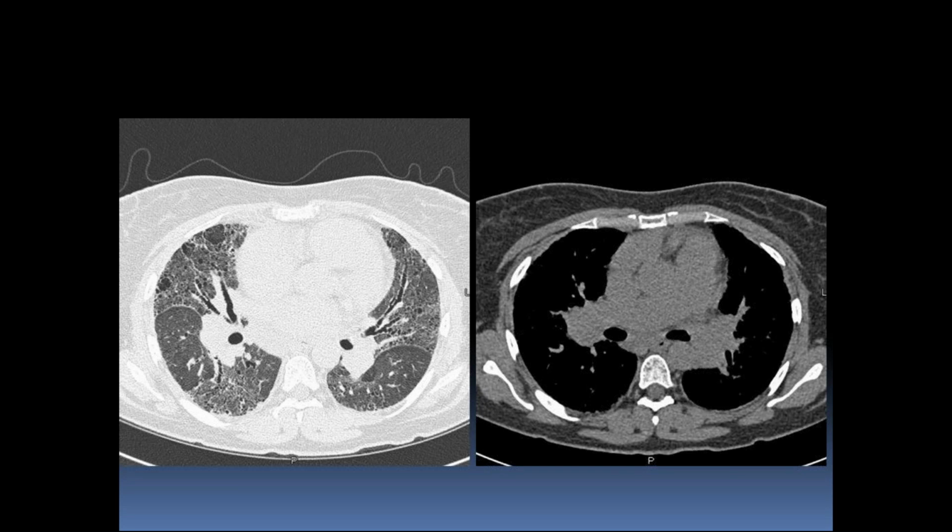Now the other image, the mediastinal windows on this other slide, kind of outlines the adenopathy. Now I know that it's difficult sometimes in the early training. I used to really demand that contrast be used in CT of the chest when I was a resident because I couldn't really figure out exactly what was going on without the vessels and lymph nodes lit up with contrast. But after looking at a number of these, after 10 years, I feel more confident being able to do it without contrast.